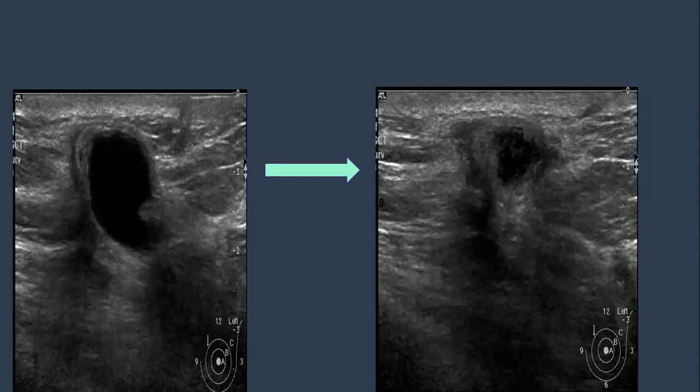Surgery on fibrous tissue is liable to be. There is distortion here. There are some distortions. Look for the distortions. Distortion and increased echogenicity. Okay, yes, the seroma cavity or the central part is getting less, but getting heterogeneous, and even look here within, getting a thick wall.